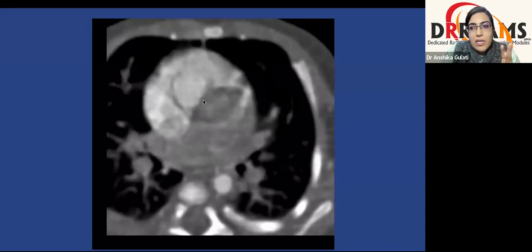And third was relationship between great arteries. So aorta is anterior and to the right. So this is DTGA. So first 3 steps of the segmental approach done: situs solitus. Second, D loop ventricular topology. Third, the DTGA type of arrangement of the great arteries. Then coming to the fourth step, that is AV relations.